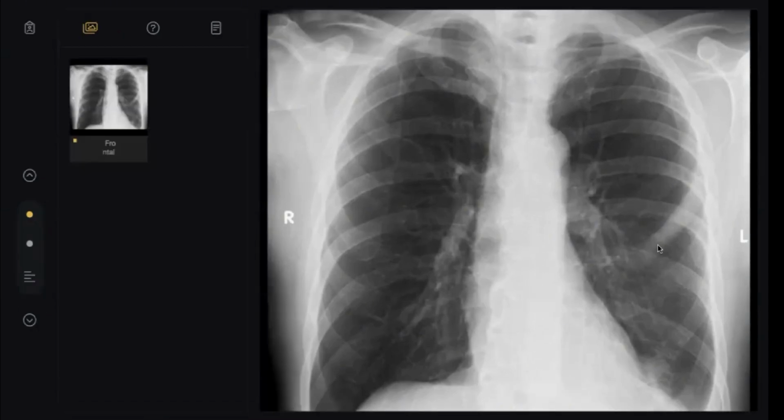Why? Because most of us look here separately and look here. No, look at the upper rib here and compare here. Look at the middle and oh, okay, there is a difference. The comparison is the key. The comparison is the key for all MSK, even in ultrasound.